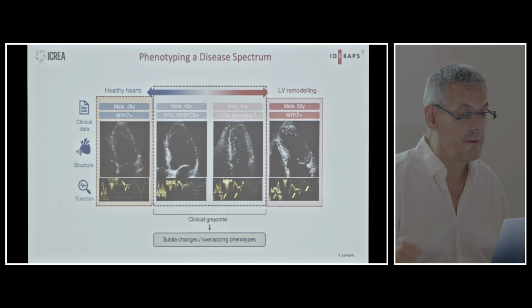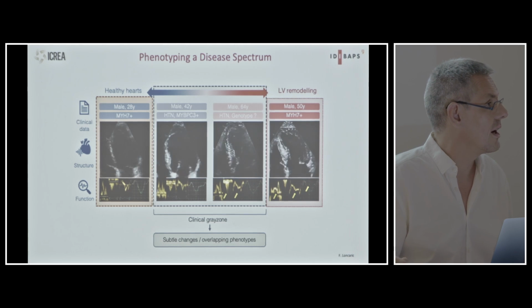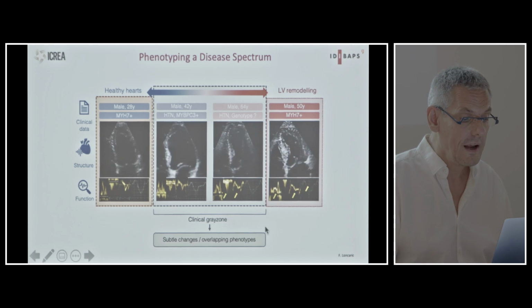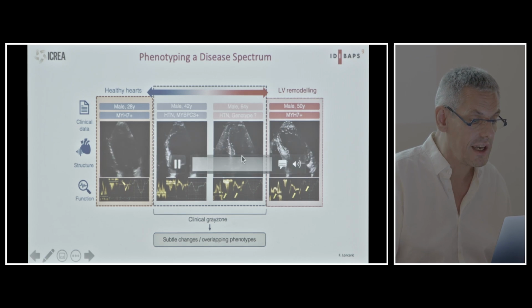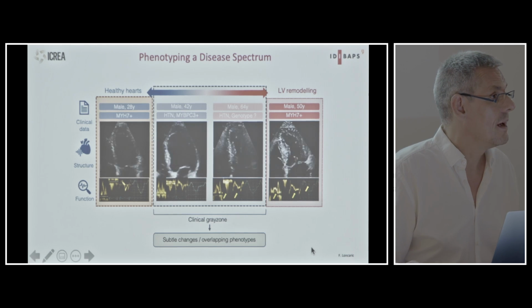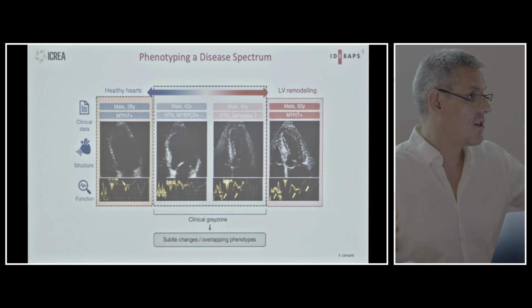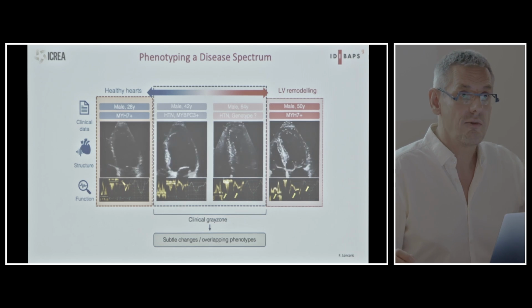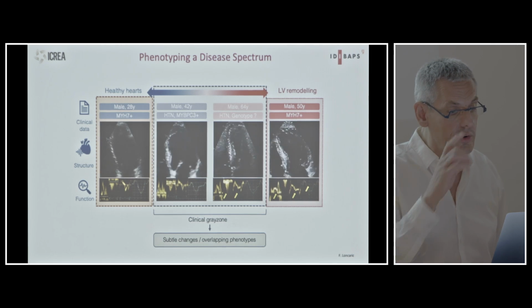And so here you see 4 different patients where the question is, do they have, for example, hypertrophic cardiomyopathy? And when you look at their presentations on the B-mode, they're very, very similar. Even when you look at some of the fillings, you see that they're very, very similar. For example, this patient clearly has a gradient, an outflow tract gradient. But actually it's a patient who is also very hypertensive. So the question is, is this hypertension the underlying problem that is causing in the end the outflow tract obstruction, or is this a really true hypertrophic cardiomyopathy with a sarcomere mutation? So these things we need to try to understand.